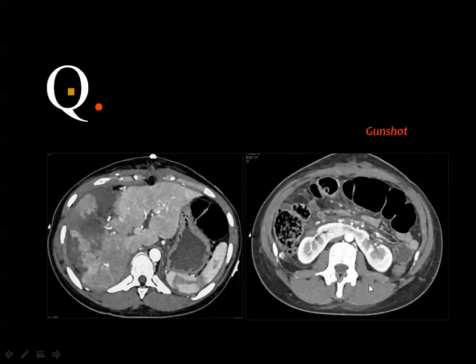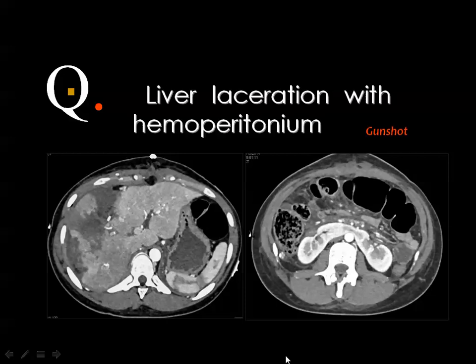This is a gunshot injury of the abdomen after contrast injection, and you see lacerations of the liver. Do you think that this is laceration or enhancement in the arterial phase? This may be due to non-homogeneous enhancement in the arterial phase. But if this is the track of the gunshot, possibly, then it will affect the liver only, and you also have a horseshoe kidney, an incidental finding.